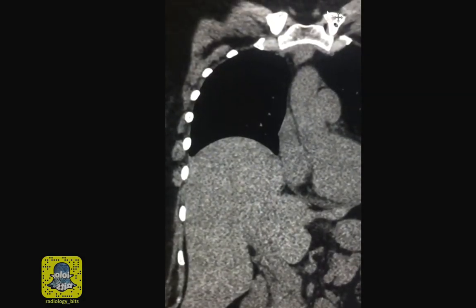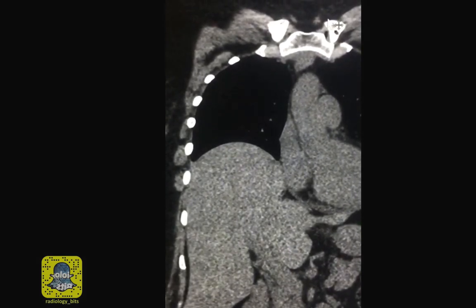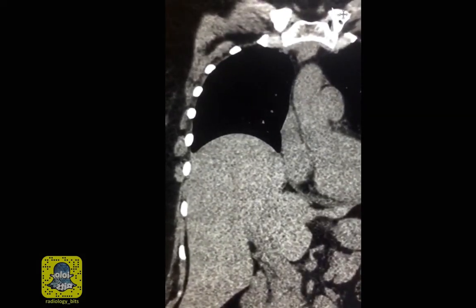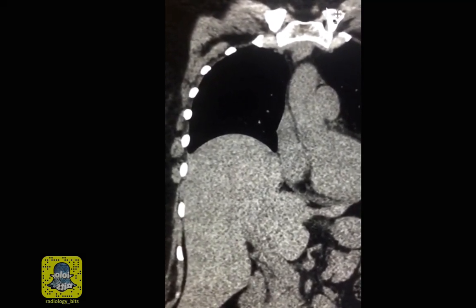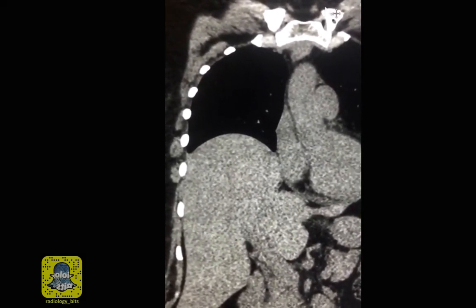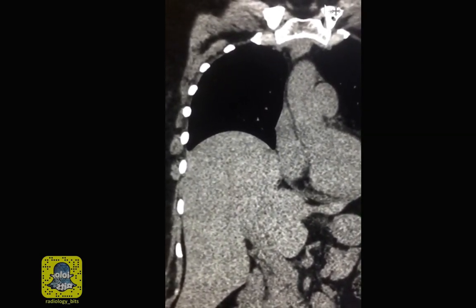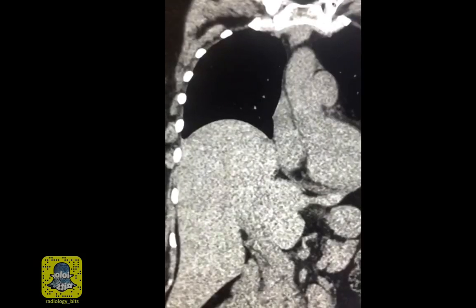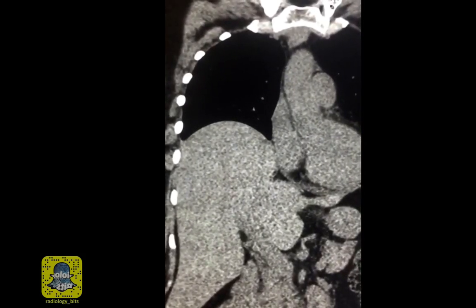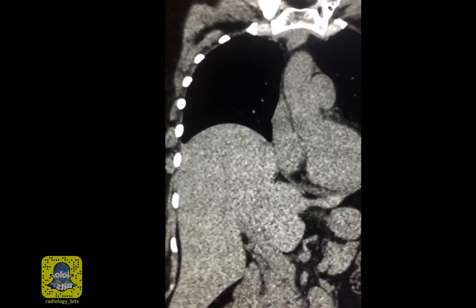So summarizing what we talked about, elevation of the hemidiaphragm could be due to various causes. The easiest way to think about this is pull from above, such as atelectasis or fibrosis, push from below by soft tissue or fluid-containing abnormalities, abnormalities of the diaphragm itself from eventration, trauma, or phrenic nerve paralysis, and pitfalls on an X-ray such as subpulmonic effusion or masses arising from the diaphragm or close to it.